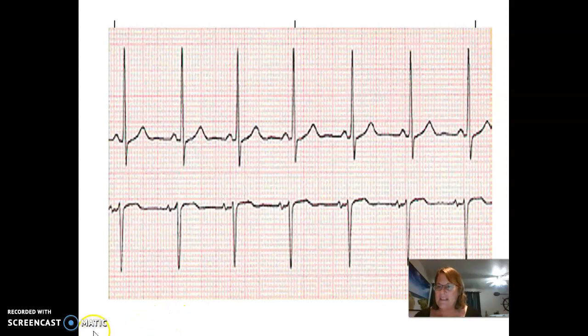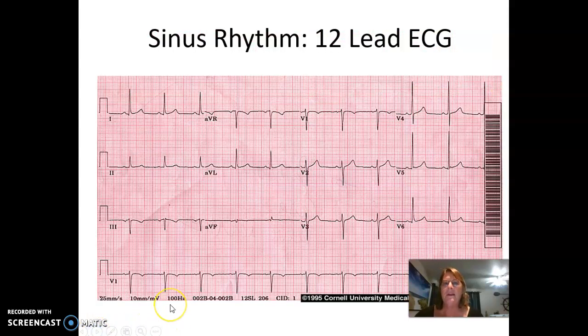All right, we will continue here. So this is what I wanted to show you: what a sinus rhythm looks like with a 12-lead ECG. This class again is learning how to do one-view monitoring. We are not learning how to interpret a 12-lead ECG in this portion of this class.